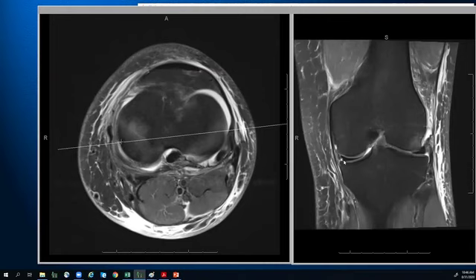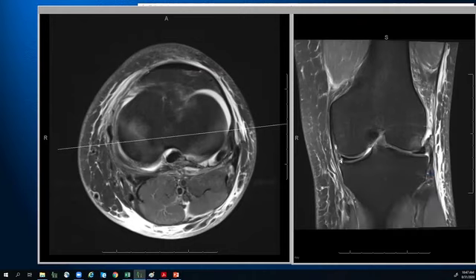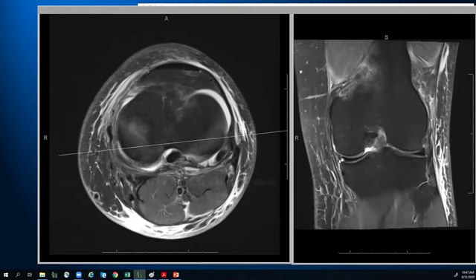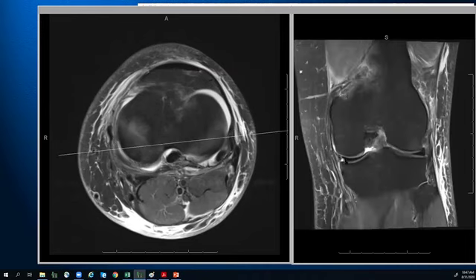Now, the hard part about vertical tears in general is when a vertical tear is located a little bit more centrally, like right here, like I've shown in earlier cases, it becomes somewhat of a no-brainer because you can nicely see meniscus on both sides of the tear. But the more peripheral that these vertical tears get, the less meniscal material you're going to wind up with separated from the parent meniscus. Sometimes it could be even a tiny sliver. So it's important to not breeze by these images and think, oh, this looks like the meniscus is normal, and who knows what this is.